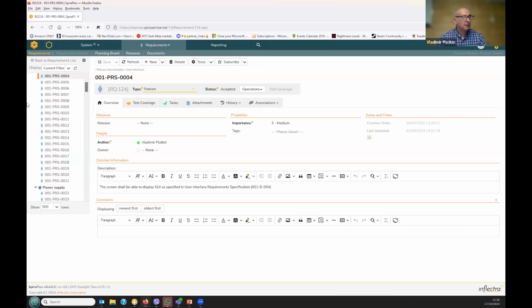The issue with a custom field is that you will need to create your own SQL script to generate your traceability reports if you want to keep those numbers.